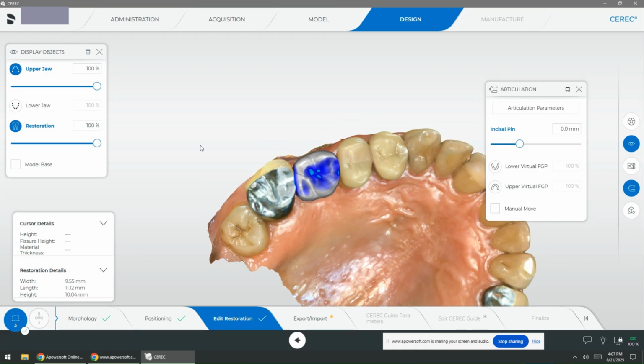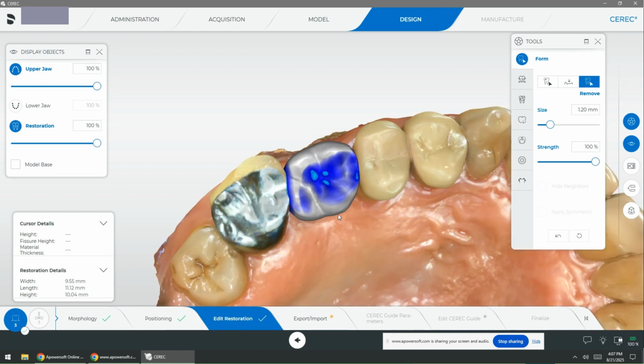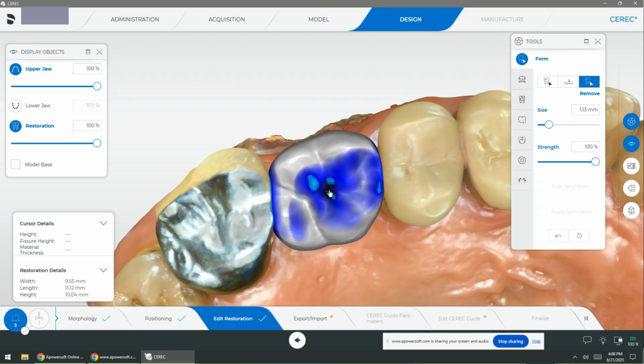So we have an implant that needs to be placed at number 3. Now, I want to use this workflow for a generic crown just to increase the efficiency in which you can get these planned and shown to your CCC, and then also for scheduling. Right now you guys have to send it to the in-house lab. They do a wax up.